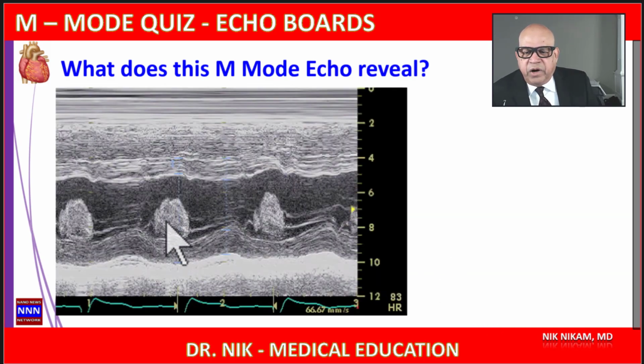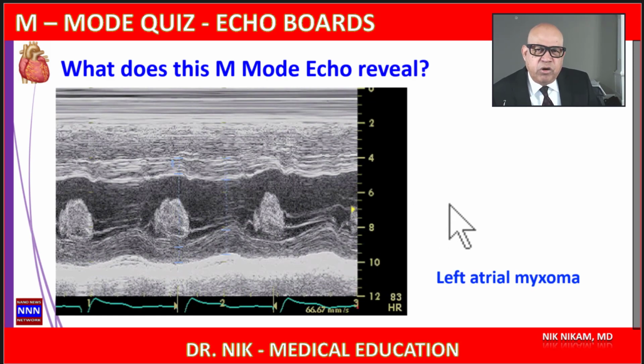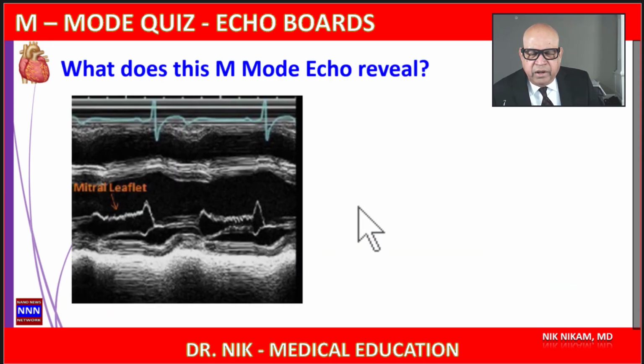Occasionally, you see something popping in and out of the mitral valve during diastole. And when you see something like this, you need to be concerned about a mass. The mass could be a left atrial myxoma, or it could be some vegetation floating in and out of the mitral valve orifice. The vegetations are generally small, isolated and localized, whereas a big left atrial mass can occupy the entire mitral valve opening. Another important point is that we could see changes from beat to beat.